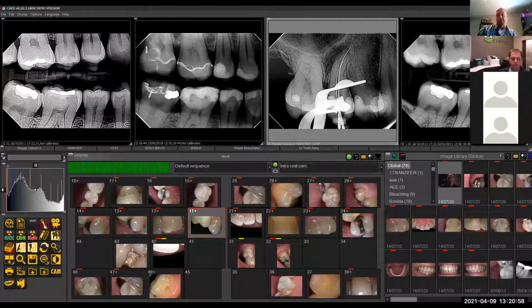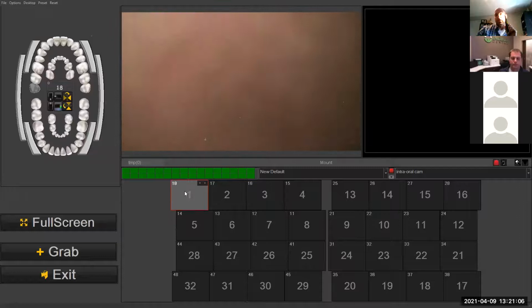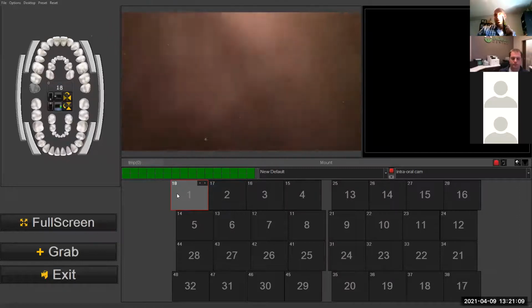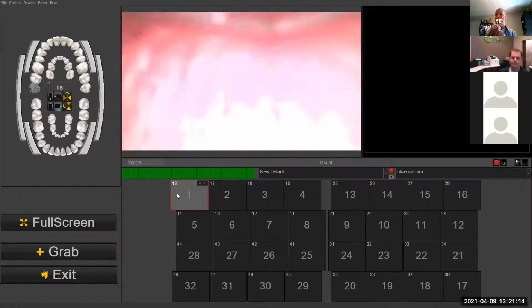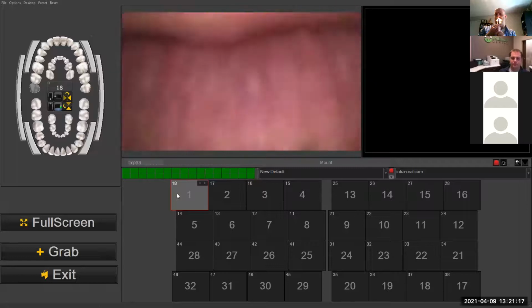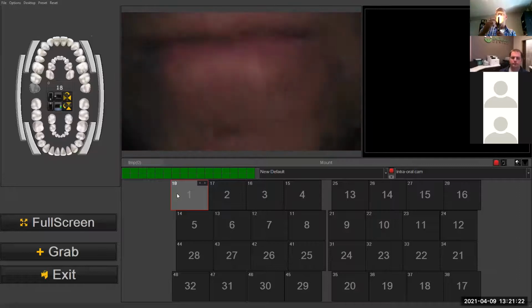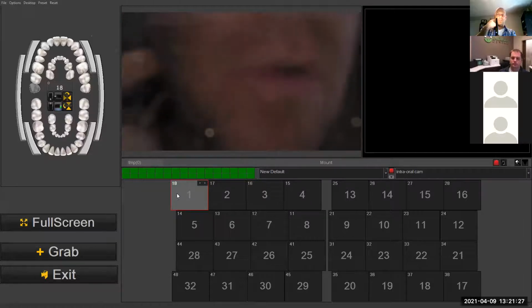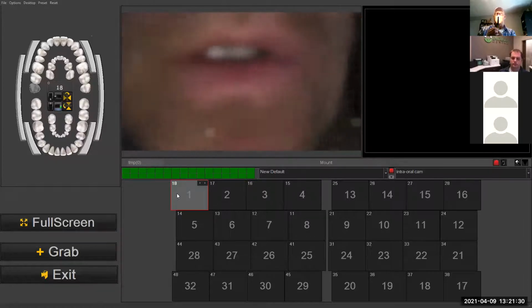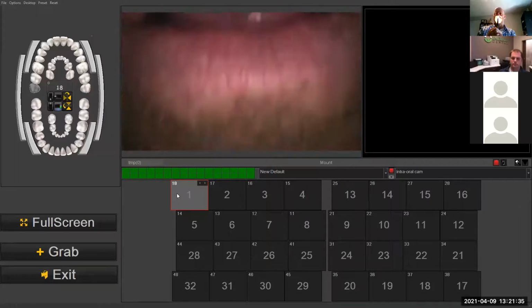This really saves your staff a huge amount of time. When you go to launch the intraoral camera, the camera will automatically start on the first quadrant. So what we train the office to do is this co-discovery, co-diagnosis. You do a tour of the mouth with the patient, starting on the first quad, then going around to the second quad, down to the third, and then the fourth. When they notice some concerns they want to take pictures of, you go in the mouth and take those shots.